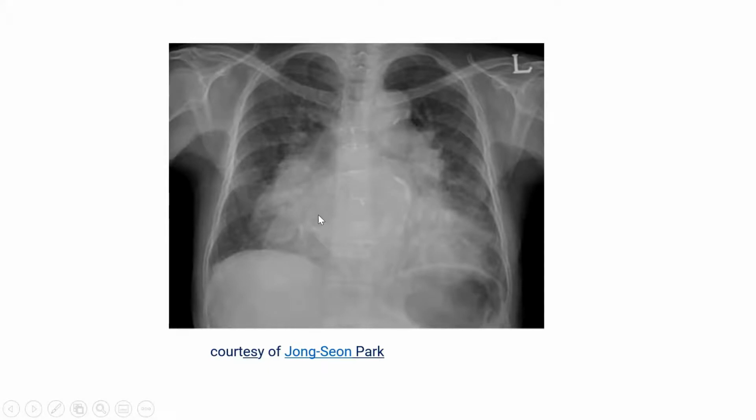And by the way, it's not uncommon to see calcification just because of remodeling, for any reason. Let's say this patient is having chronic atrial fibrillation with dilatation, diastolic dysfunction with dilatation, or MS/MR. It might lead to this amount of left atrial wall calcification.